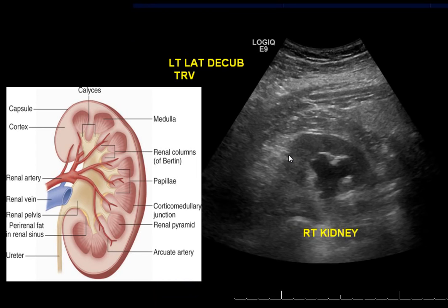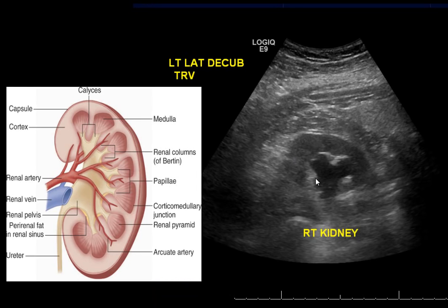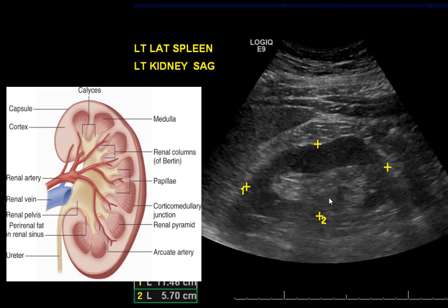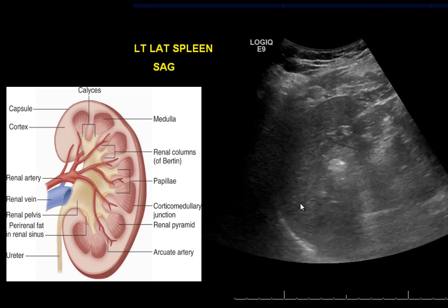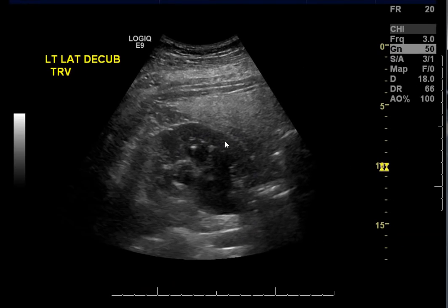So we do a lot of these studies because sometimes the clinicians cannot tell if it's medical renal disease or obstructive uropathy. So knowing what hydronephrosis looks like, we can grade hydronephrosis. This one still has a rim of renal parenchyma that is probably 15 millimeters. That's pretty good, so the kidney has not suffered atrophy yet.